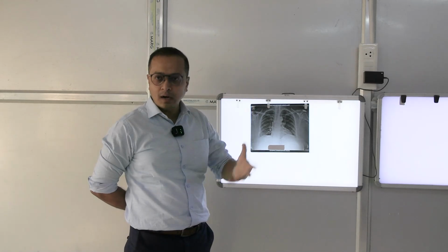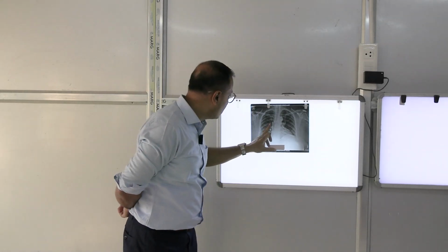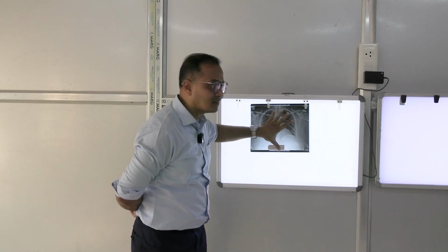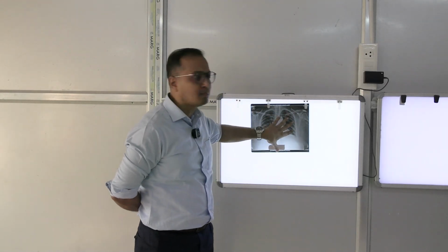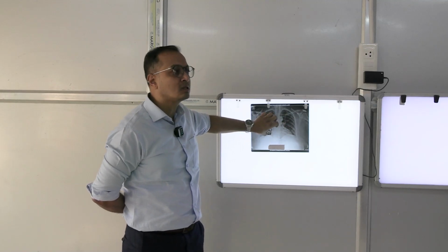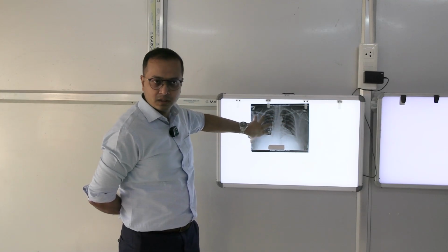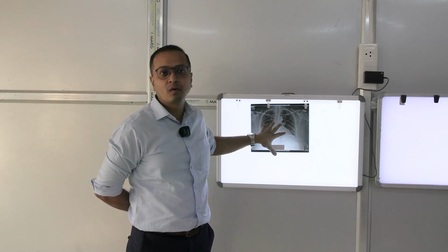Those bronchovascular elements make impressions visible on this X-ray as ray-like structures, looking like leaves. It's not jet black, so we can see this white element because of the splitting of the bronchus and the blood vessels going in. We call them bronchovascular markings.